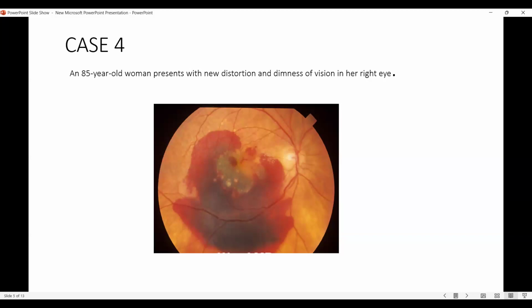Okay, then do you think there is any other sign of diabetic retinopathy? Yeah, there are hyperfluorescent dots I'm seeing in front of the macula and also surrounding it. Doctor, my question is, is this a fluorescein angiogram? How can you see hyperfluorescent dots here? What is this image?